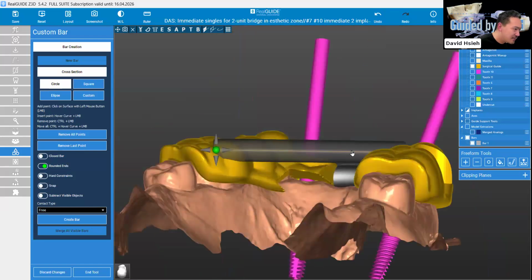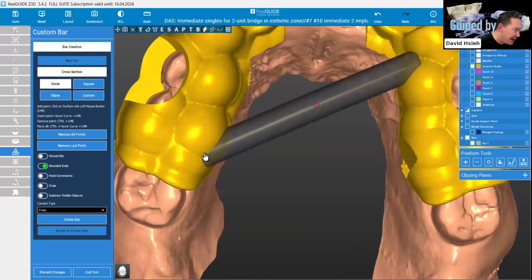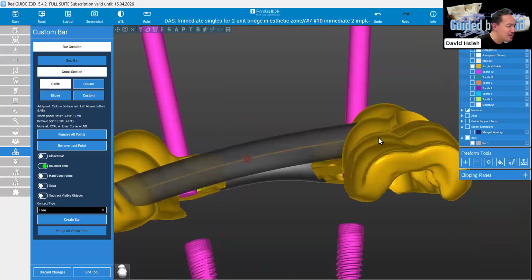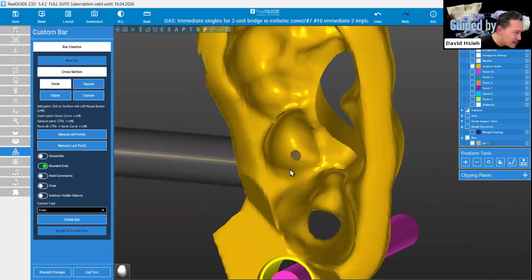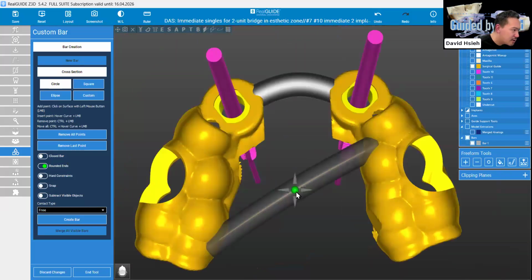So the way I design, guys, I really like those central bars because they pass the geometry center, the center of gravity. You know what I mean, right? But one thing to make sure, just look onto the interior side of the guide, because that's going to have a heel fitting right there. And then that's one bar.